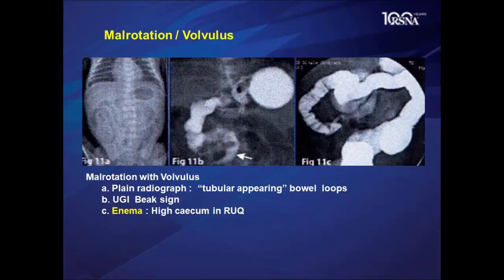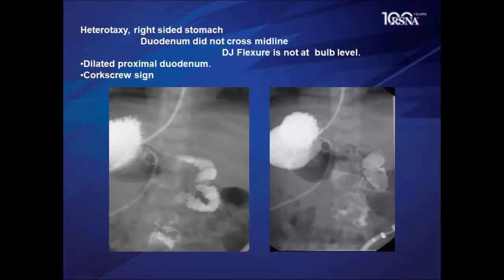I'm showing you these challenging cases because this baby had heterotaxia. The stomach is on the right side, and he was not only vomiting chronically to a point that he was malnourished with ascites. So he was fed with a G-tube here, yet the contrast study demonstrates that the duodenum, the patient is not prone, it's supine, but dextrogastria. Duodenum on the left, one would think that you expect the duodenojejunal junction here. It's not the case, it goes here, so it's not fixed.